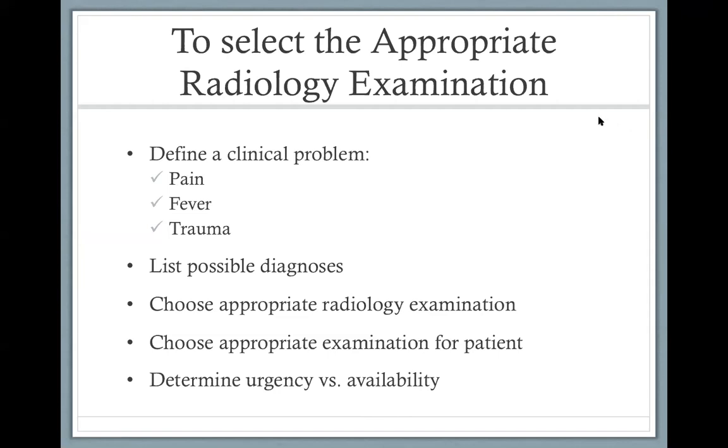So there is a question, we do CT, X-ray, and MRI, why we do all of them? That's a good question. Sometimes we need more than one imaging modality to get a better understanding of the problem. Ideally, we should try and get the answer from one imaging modality, but sometimes it's not possible. So a good example is the pneumonia I just shared with you. Most probably the patient had an X-ray once, twice, and then he was not improving, and then they thought of a complication.